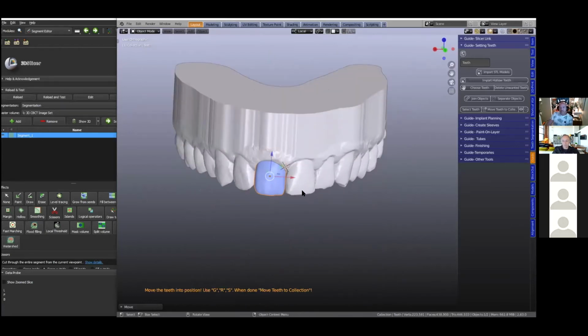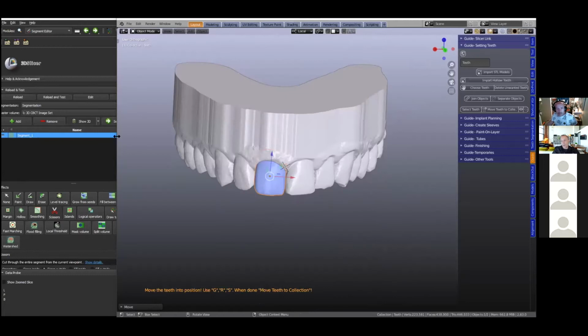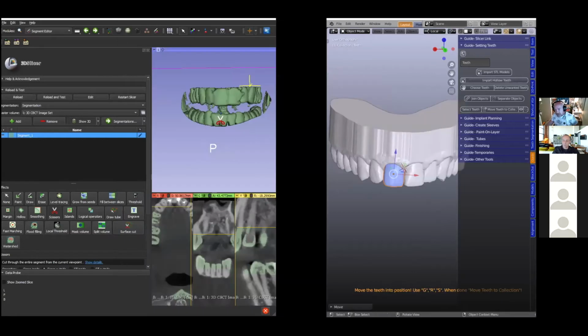All right. Okay, so we've done that. So we've covered this, and now we're going to go to the slicer, and we're going to get our axes correct so that we can actually view the bone from the correct position. Michael, so do you do the one-off transfer? Can you elaborate why we do a one-off transfer? I'll do that as soon as we've done the alignment of the axes.